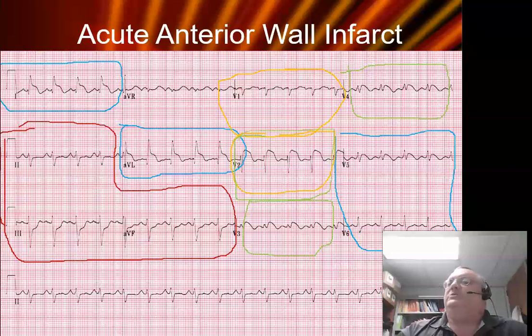So when you start looking at a 12 lead, take a good, solid look at your leads and where you're seeing elevations. I'm going to find my baseline, because remember how we find our baseline. I've got elevations here because the ST segment is way high, right here it's really high, and right here it's really high. As we all know, these are the anterior leads.